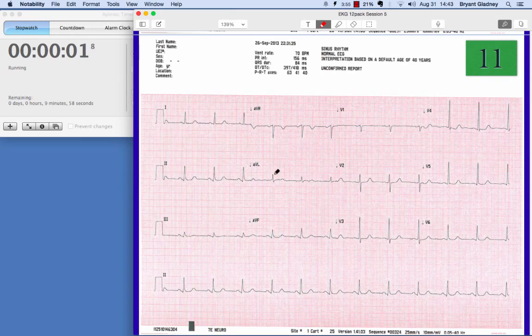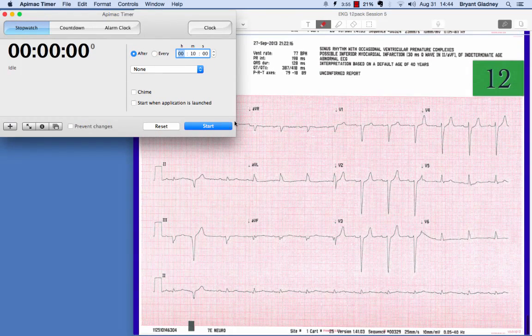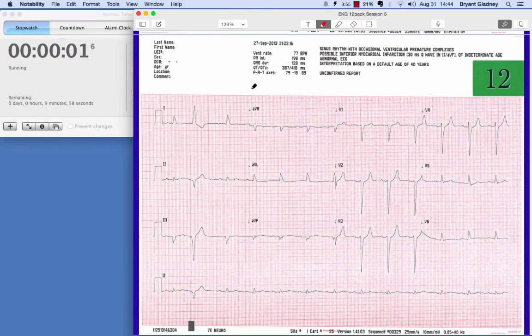So by this point you ought to be flying through these, because really this is several reps on very normal, no problem EKGs. The rate's 70. No dropped beats, no extra beats. It's quite regular. PRI is in the range. QRS is less than 120, and 450 would be the high end of QTC. This one's fine. No bundle branch, no axis things to worry about. Last one in this set. Promise we'll have a little more challenging ones for our next session.